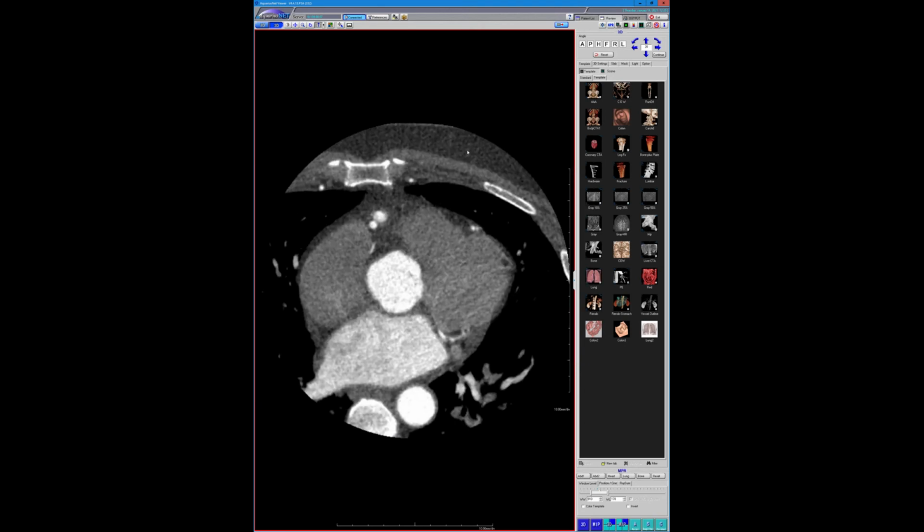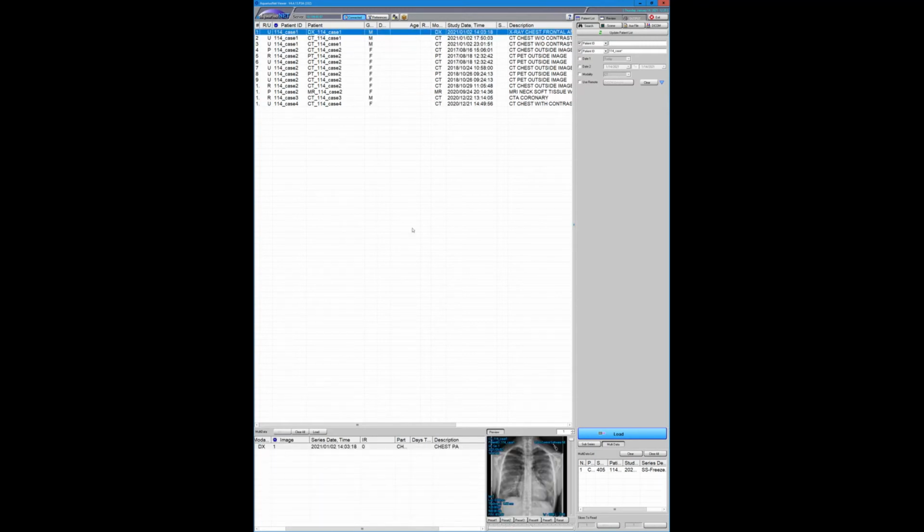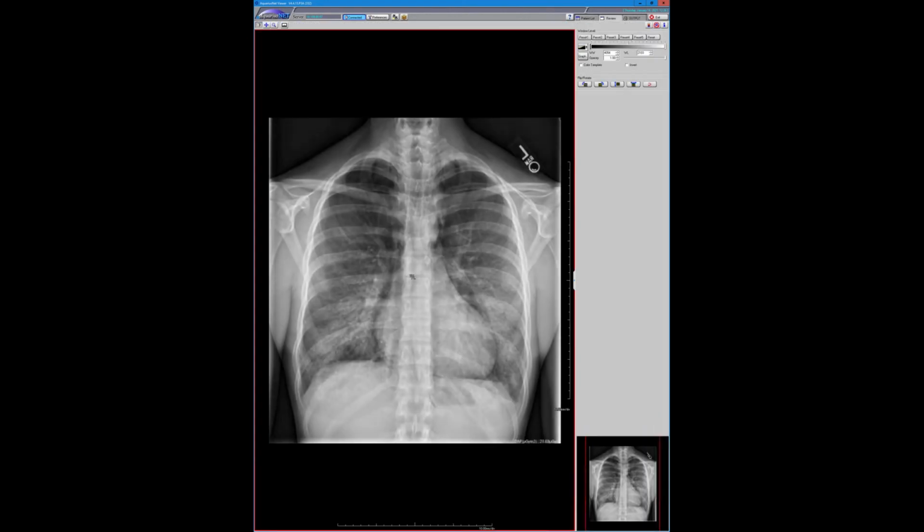You know, I've not seen one that is that small, just sitting right in there. And this guy doesn't have any mutation. I just don't, and you can almost see there's a little vessel going into it. We're just not sure why it didn't get seen on the cath. We're convinced that if they did some better injections at different angles, it might have come off. But again, he has no explanation.